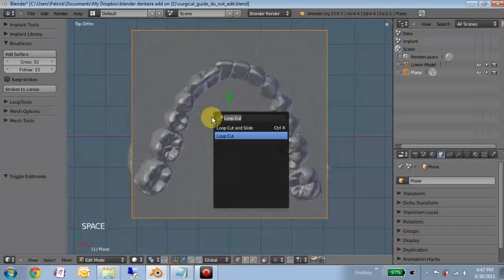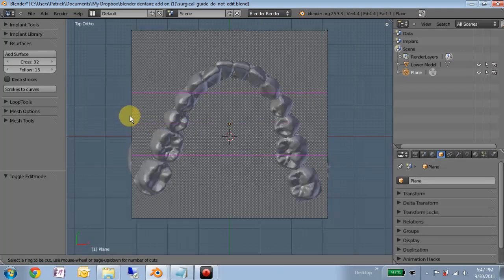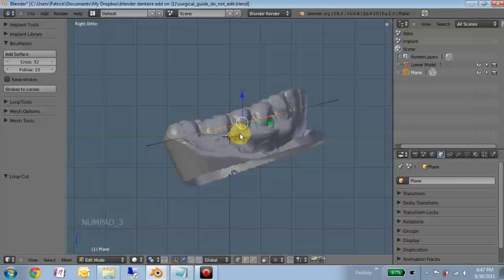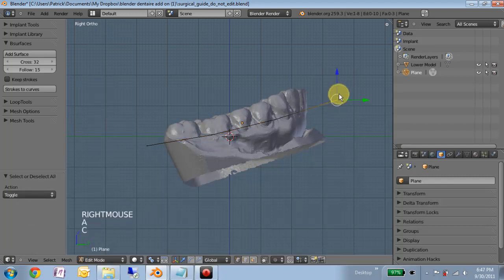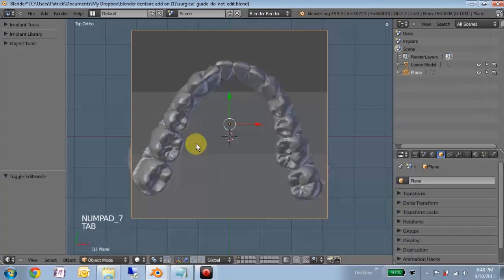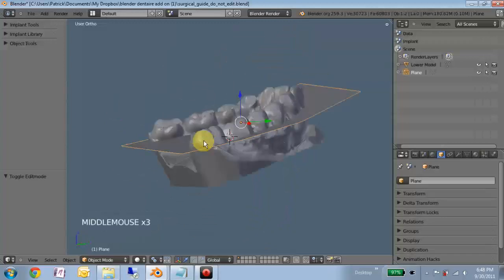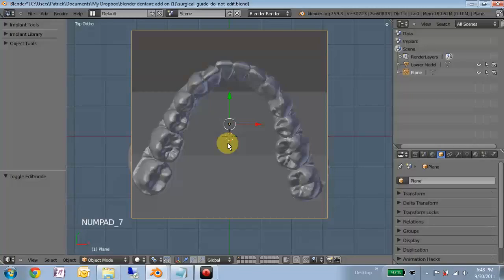And you'll see, we could drag this down a little bit to kind of give ourselves some more accurate limitation here, but not necessary. For proof of concept, this is what I want to show.